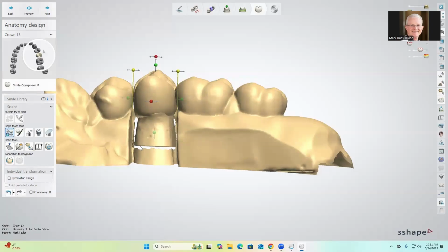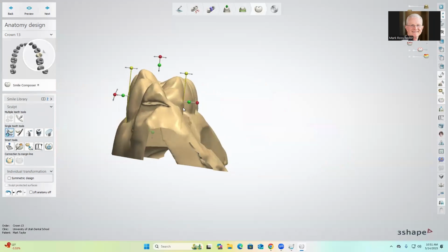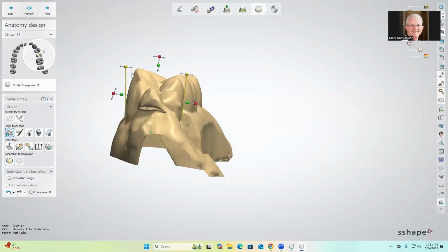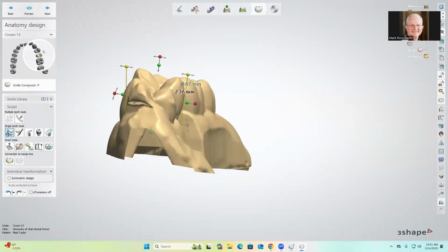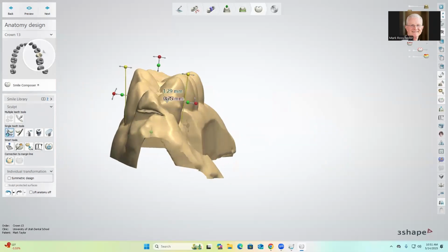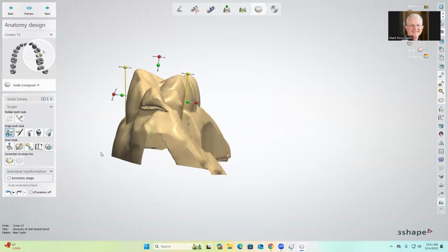The margin will never be finalized without the crown attaching to that margin. So what I've done is I've just brought those lines directly where we're at. Now we can say, oh, now it's under contoured in this area. So I can bring this yellow, and it brings that area right into that alignment. It's too vertical here, but we'll change that in a second. Same thing here. We want to bring this out a little bit, and you can see how bulbous this is here, and how flat this is going from the margin up. So we can actually change a lot of that.